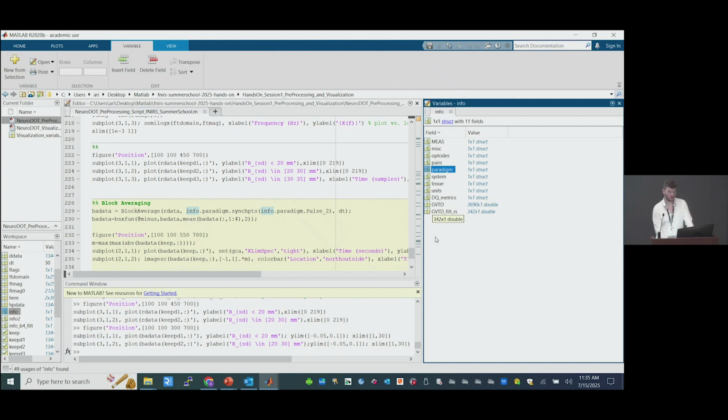We support over 7 different types, but I've seen data that has like 24 different conditions from a collaborator over in the UK. Depending on your stimulus paradigm, everything is modular.